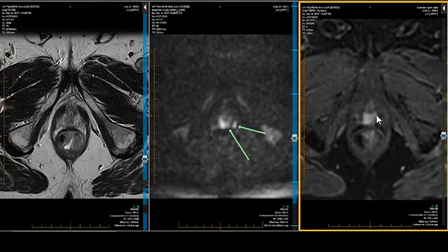It looks like it crosses the midline on dynamic contrast enhanced MRI, again, a T2B lesion. It does not violate the capsule in any way, and the other lesion that we saw did not enhance. So I kind of use that as a tiebreaker, but we'll direct them to biopsy this lesion, although this one would be categorized as a RADS 3 because it doesn't have a very good correlate on the ADC map.